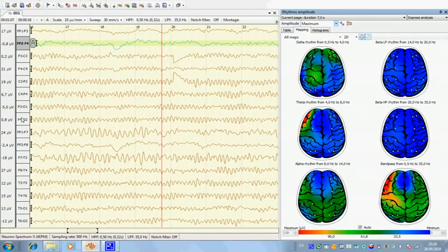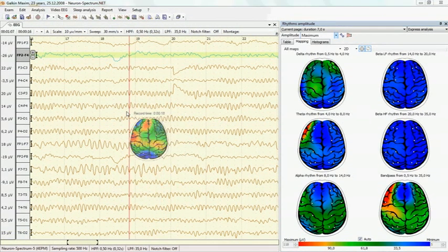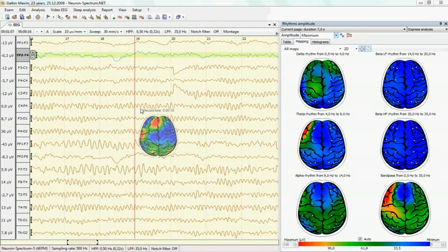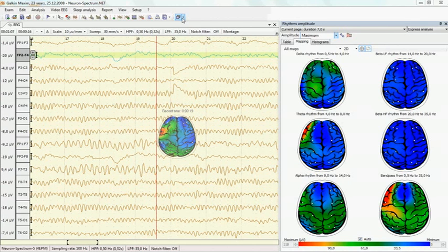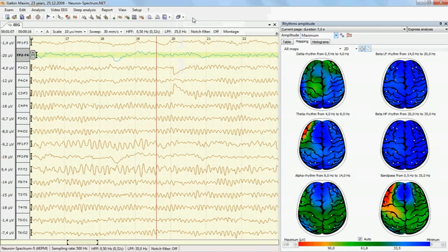Also, you can see the amplitude panel and momental amplitude marker. Also, you can see that toolbar buttons are small in this work table.